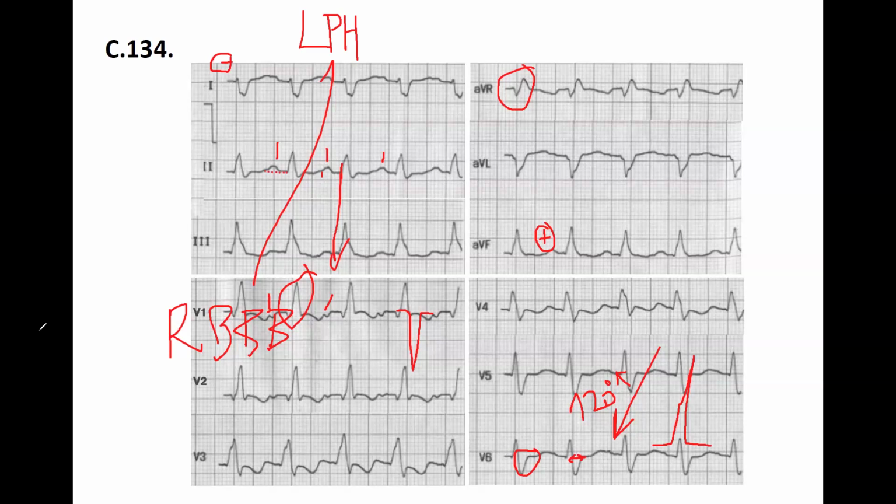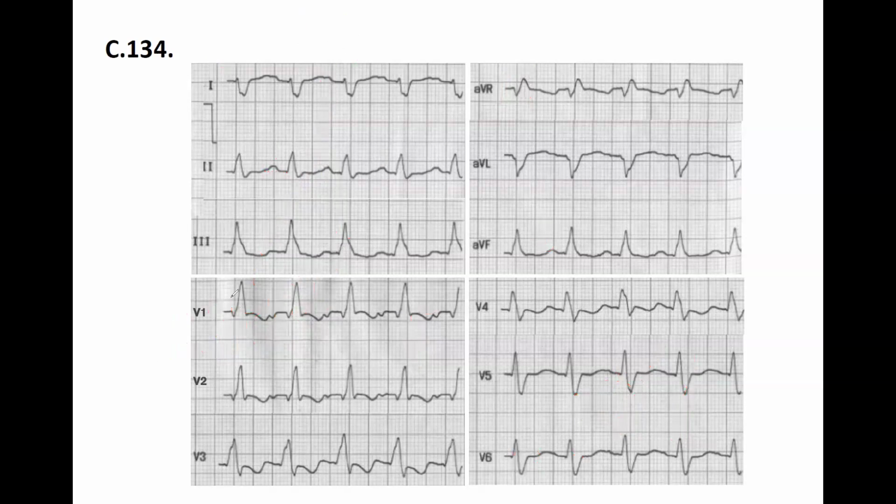So we're proving that the supraventricular rhythm can be sinus rhythm, can be atrial rhythm, can be junctional rhythm. These all mean supraventricular rhythm. And if the QRS is wide, then you can say that's an intraventricular block. Okay. Perfect. Thank you so much. All right. Let's go to the next one.